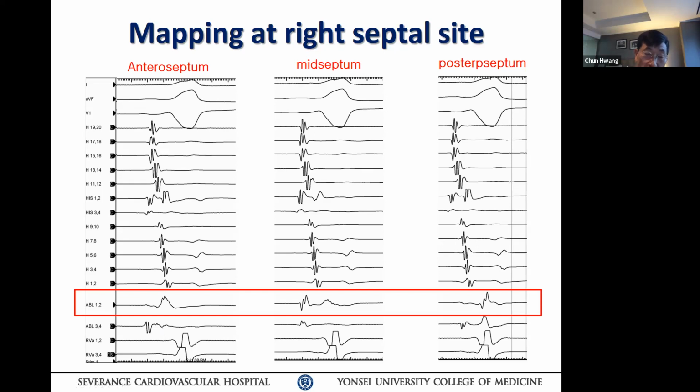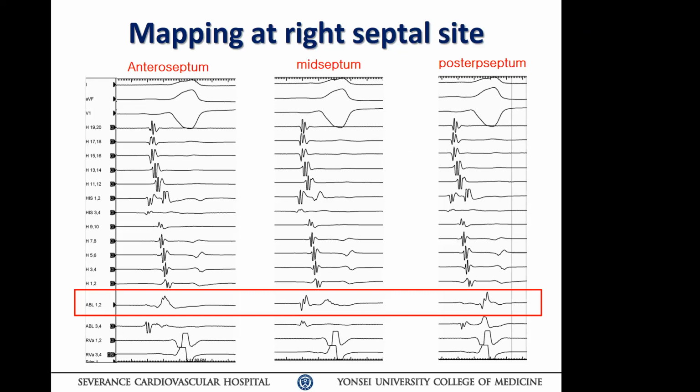The reason is, first of all, you're more toward the atrial side of the tricuspid annulus. Second, your energy delivery is more efficient, because the tricuspid annulus is a very difficult structure to target. And when you see such a small A, your ablation catheter is not stable. I bet it's shoving around back and forth. That's the reason I think you got rid of this pathway. Also, anteroseptal pathways typically do not require too much energy. It's a very thin tissue. If I were ablating this, I would ablate at 3, 4, not 1, 2. Okay? That's as much as I can tell you from my experience.